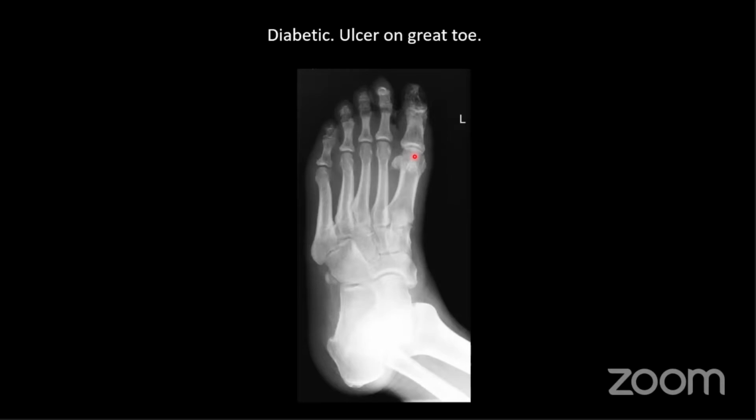Okay, so some people have said CT, some people have said MRI. In the first instance, I think it depends how high the clinical suspicion is, but normally, at least in our center, we recommend also doing a follow-up film.